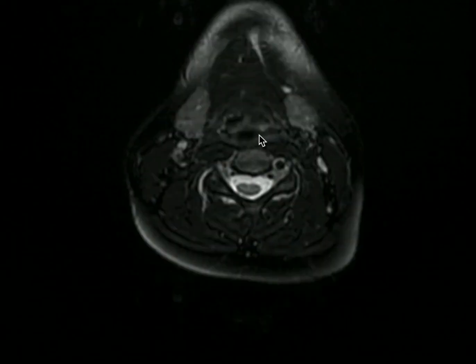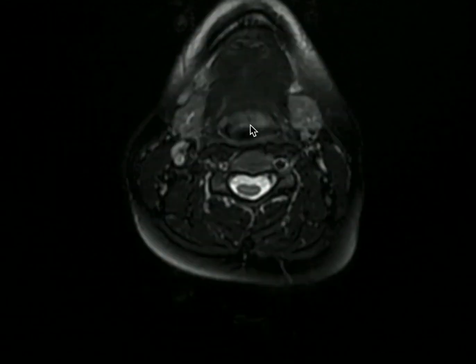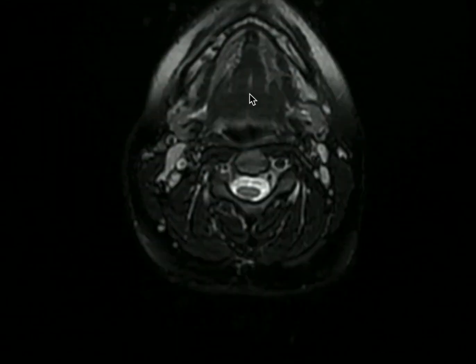Here on our axial T2 weighted MRI with fat suppression, we again see the trachea lying anterior to the esophagus. As I scroll superiorly here, I'll point out the cricoid cartilage. Further up, the thyroid cartilages here, and further up, the aryepiglottic folds here and here lying anteromedial to the piriform sinuses. Further up, we see the epiglottis here and the valleculae just anterior to it. This is our median glossoepiglottic fold. From here, we go up to the oral cavity.